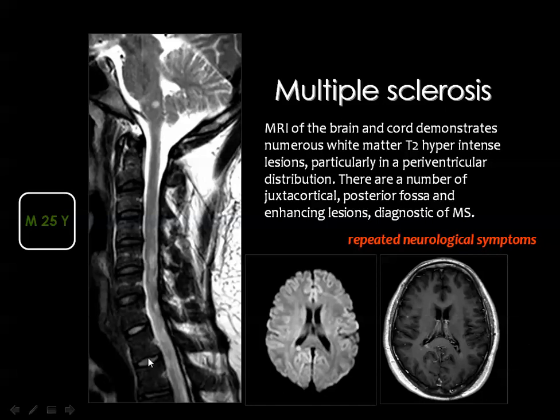And we used to do brain MRI whenever we are confronted with a case of cervical spine MRI with multiple or single focal lesions of high T2 signal inside the spinal cord, thinking that this may be MS, or multiple sclerosis.